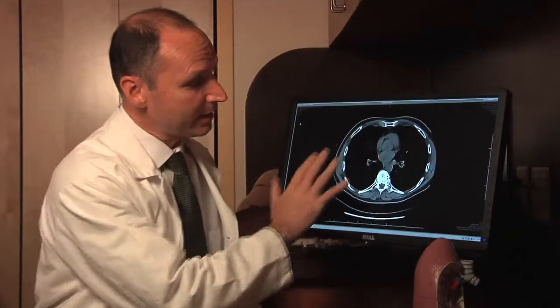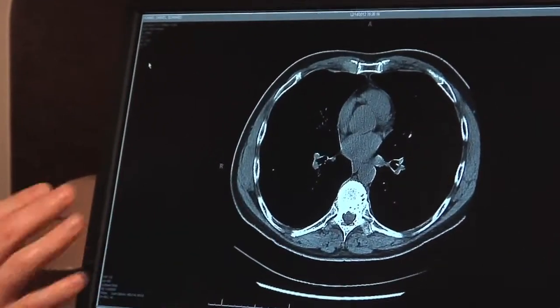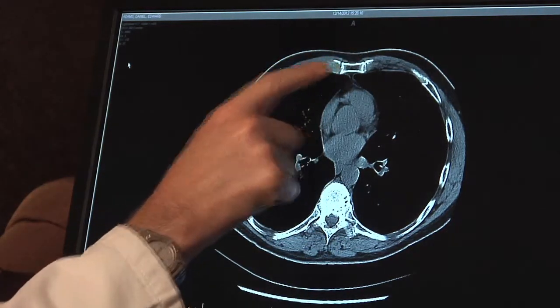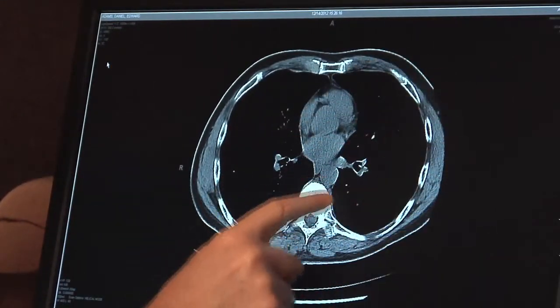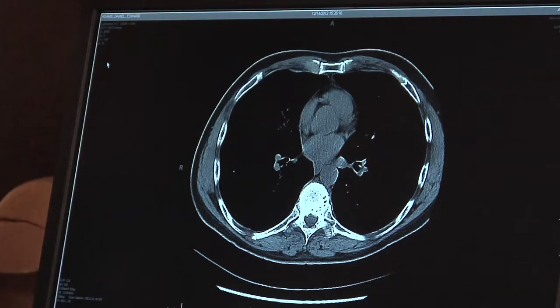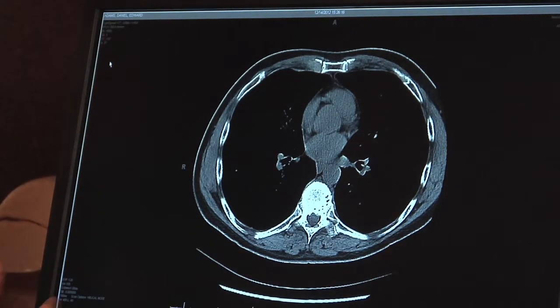So this is a CAT scan through the chest of somebody with a lung cancer. Now, if you're standing at the foot of the bed, then you'll know that this is the backbone here, this is the breastbone, the front of the body, this is their right side, and this is their left side. Now, I currently have the imaging set so the contrast will show us the soft tissues of the body, the bones and the muscles.